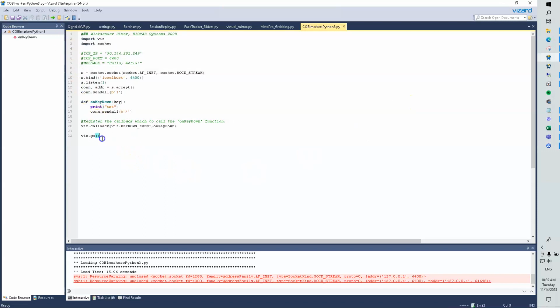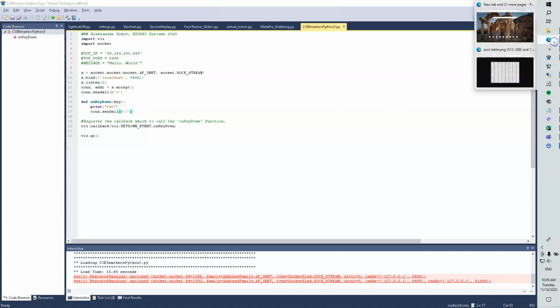This is the code. There is this initial set of instructions that have to take place, and from then on, to send markers, that's the command. And here is the ASCII code that we're sending. This corresponds to number 47.